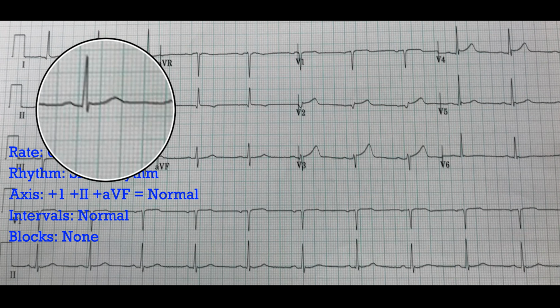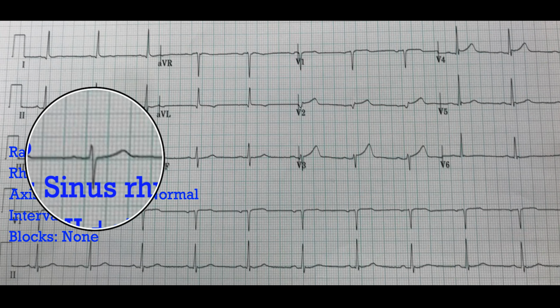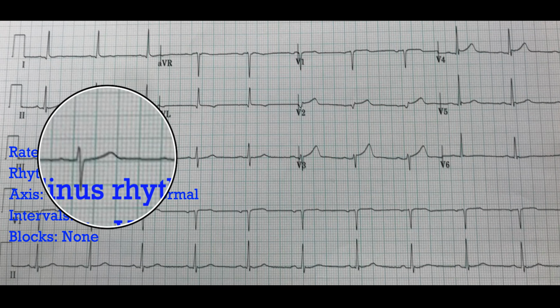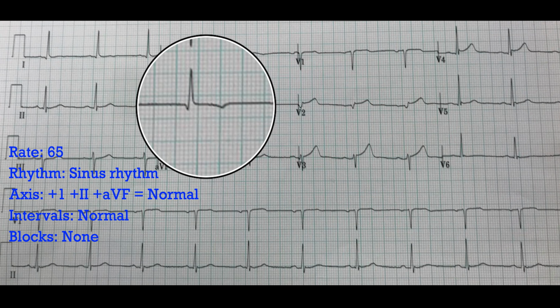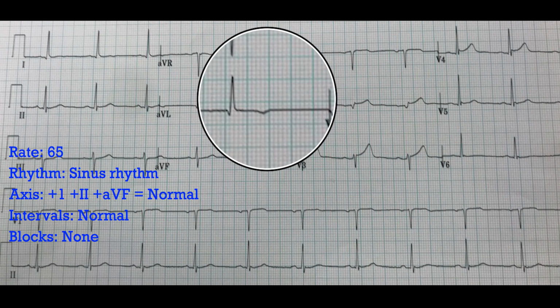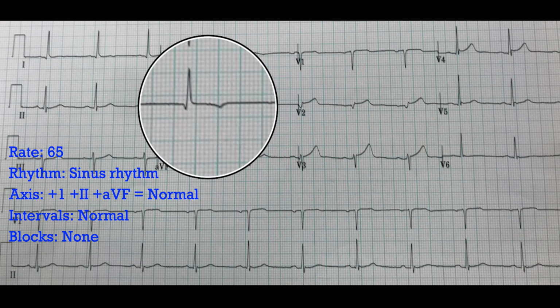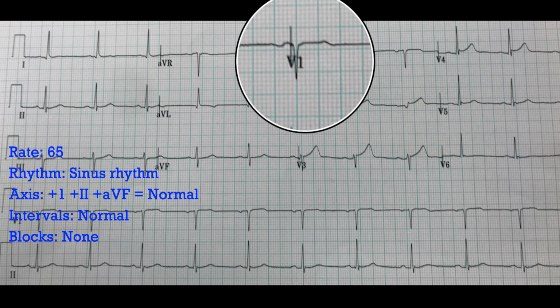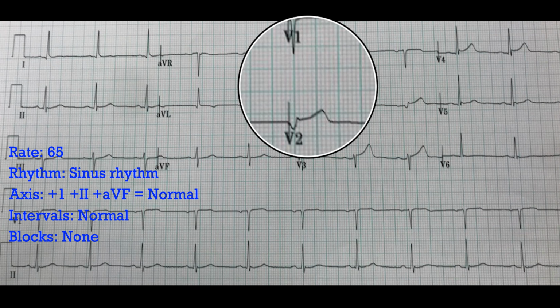How about here? Any ST depression or ST elevation or flipped T wave? Nope. How about here? Again, nope. And then scanning down through here, not really. Maybe there's an inverted T wave there. That might be old. Sometimes you see that. No obvious ischemia thus far, just a little T wave inversion there. How about when we go through the precordial leads? Let's see, lead V1, no.